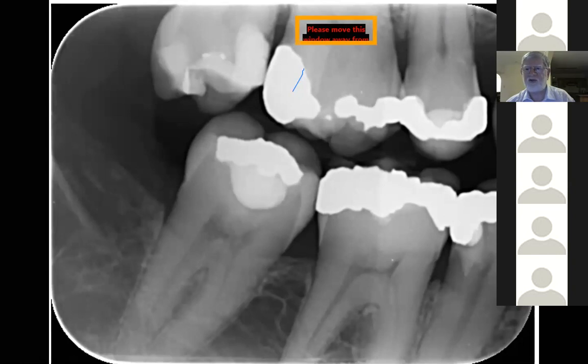Right, very good. So we're talking about sclerosis, tertiary dentine formation, occlusion of the dentine tubules, and that's great because the body starts to form secondary dentine. It doesn't like the fact that decay is approaching the pulp, so it starts to occlude all those dentine tubules until this looks quite sclerotic.